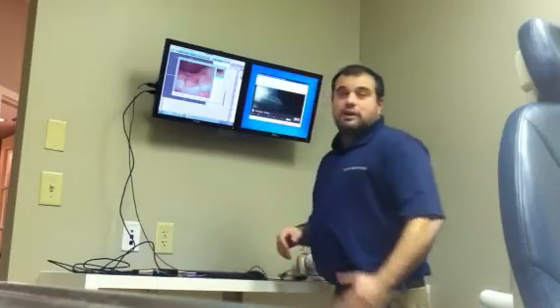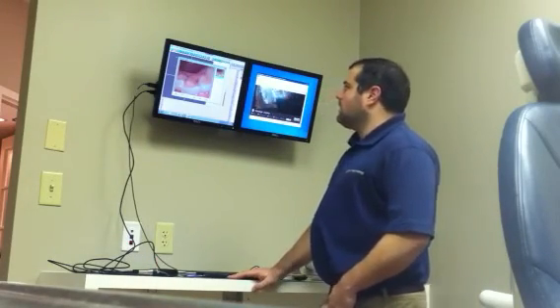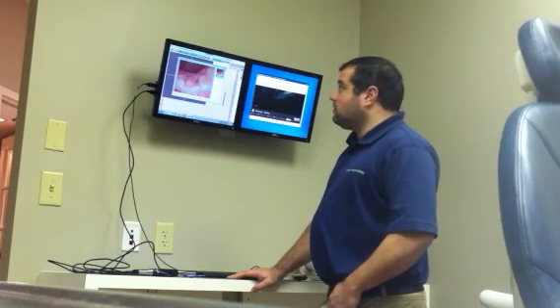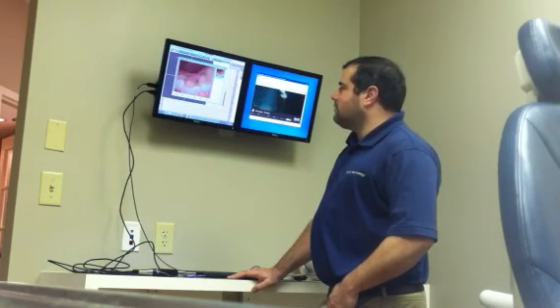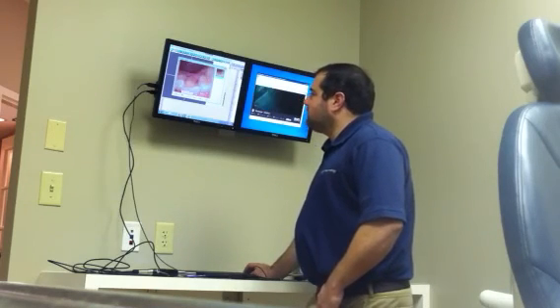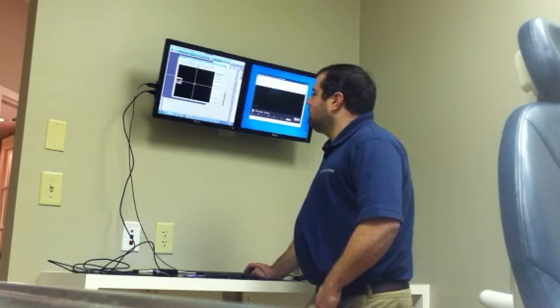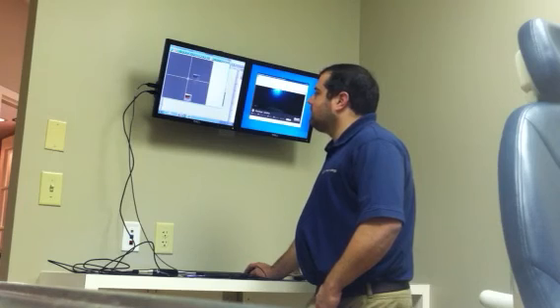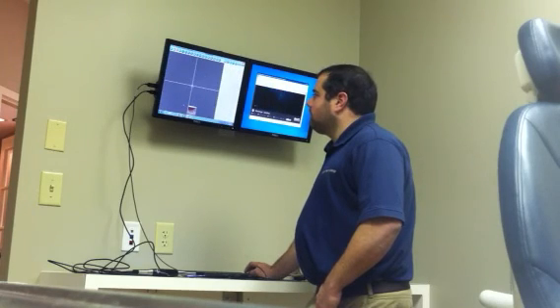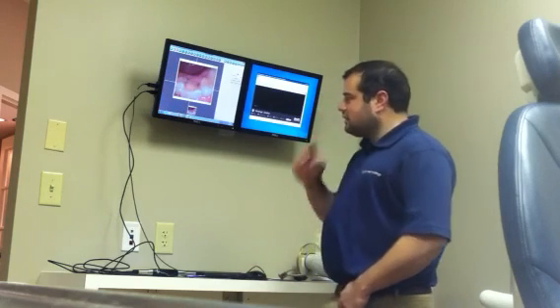See, we have a nice big video preview window that opens up, and that's a very good picture of my very poor dental hygiene there on the screen. Go ahead and select that, give that a tooth number, and return that image back to Dexis, where of course we could move around and do all the things we normally would inside Dexis.